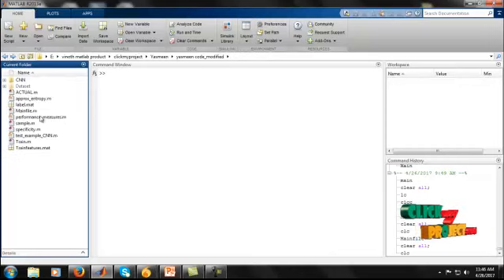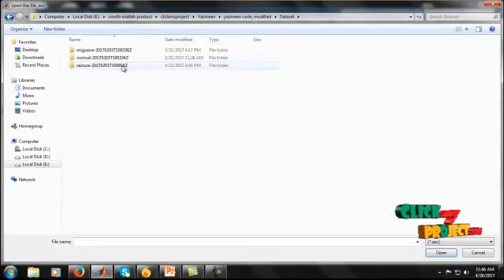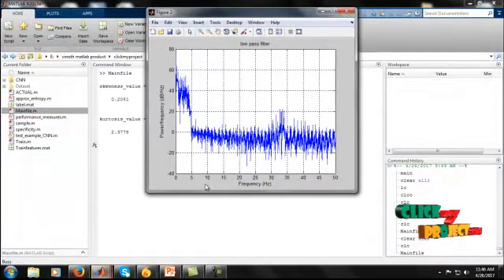Then there is the MATLAB file for our process. Our source code is stored in the main file .m, so we have to run that file. When I run that file, it goes to the datasets. In the datasets, I click any one of the datasets. For example, I have clicked the seizure detection dataset, and then the process will be going on.